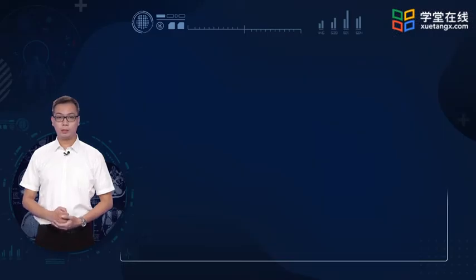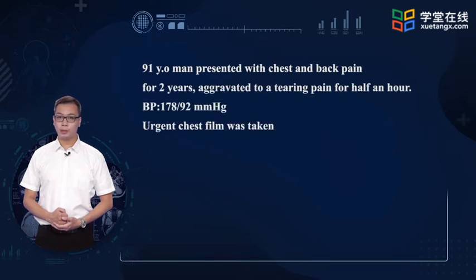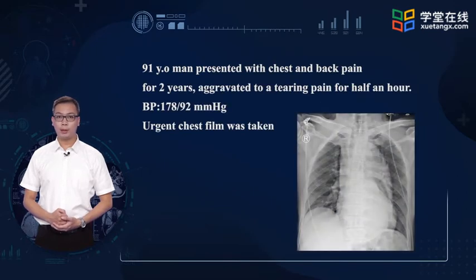Let me start with a case. This is a 91-year-old man presented with chest and back pain for 2 years, aggravated to a tearing pain for half an hour. He was admitted to the emergency room. Hypertension was found and an urgent chest X-ray was taken.